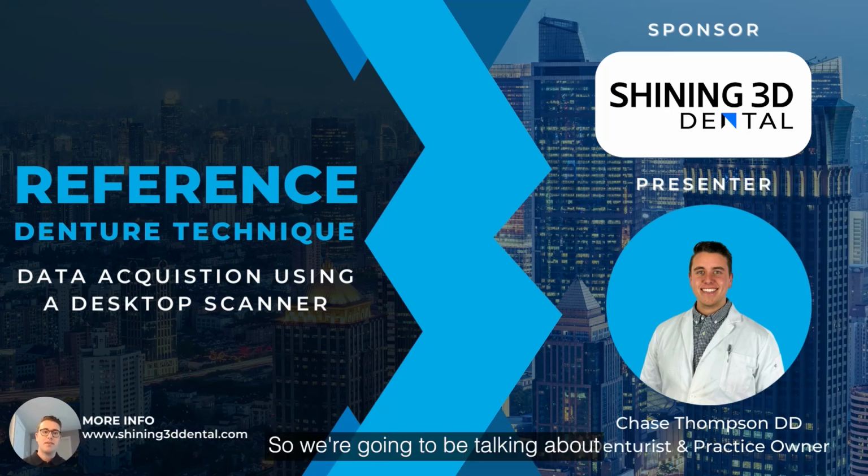So we're going to be talking about the Reference Denture Technique, and then subsequently we'll talk about data acquisition using a desktop scanner. And more specifically, we'll talk about the custom workflow within the Shining 3D software and how you're going to set up a work order to capture all the data that you need to and align it properly to proceed with designing a new prosthetic for a denture patient.